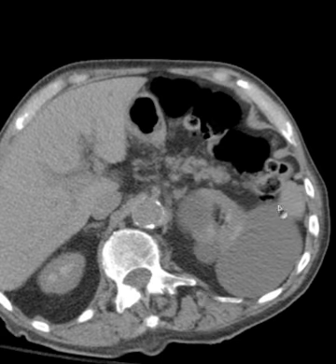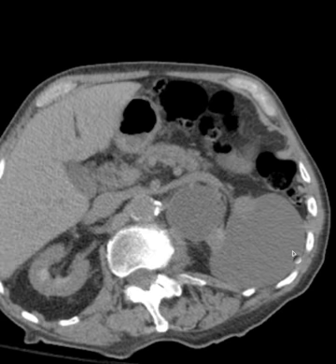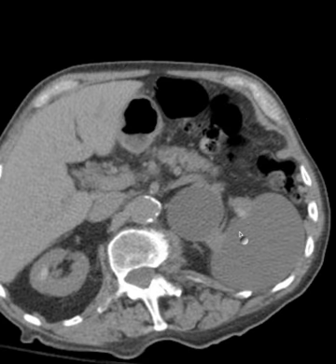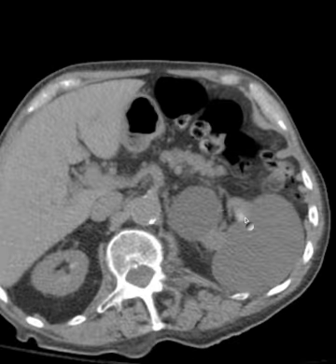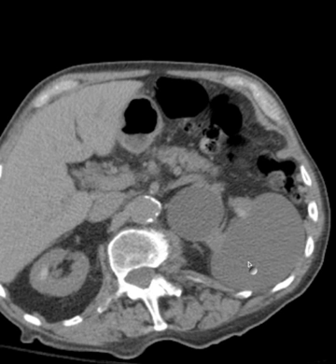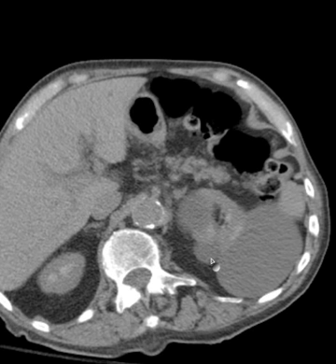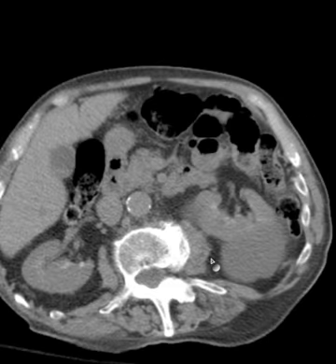And these are just very good examples of cysts. And this is one honker of a renal cyst. Look how it distorts the normal anatomy of the renal cortex. So a very large cyst here, and sometimes they can be completely asymptomatic. And here's another one here, and then there's a smaller one up there, and then follow it down.